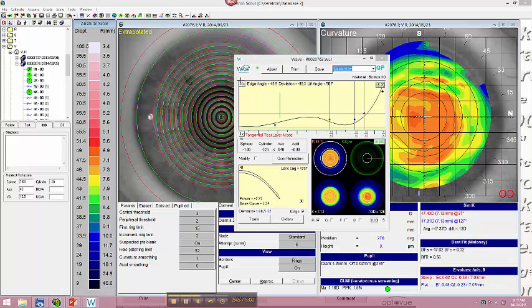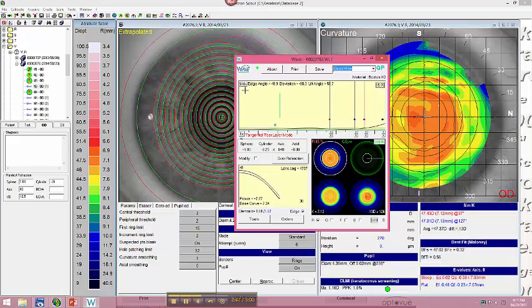So now after saving it, I reopened it and I changed this to 560, this to 8x, and I'm going to go up on the edge to get the lift angle to about 41 or so. Go down the pink a little bit. So I want to kind of get a little starting point at 41 lift angle and a center of about 100, 120 microns.